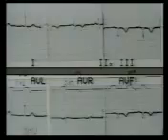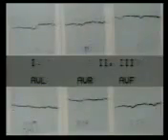This ECG shows T wave inversion in 2, 3, aVF. This indicates ischemia in the inferior wall, probably narrowing of the posterior descending artery. Now observe this ECG. The T waves are inverted in all chest leads. They are also inverted in limb leads. Generalized T wave inversion is seen in the second phase of acute pericarditis.